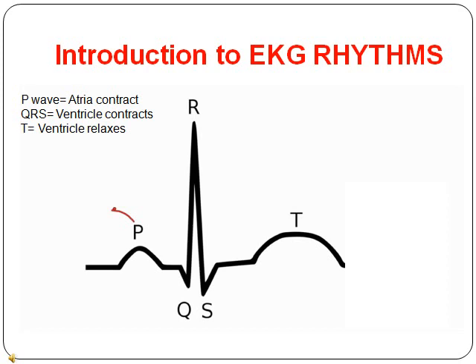So why this is important is because if the P wave is not there, you know it's an atria problem. If the QRS or T wave has something wrong with it, it's a ventricle problem. Sometimes you see a U wave, which is like a little wave after the T. Not every patient has it. They think it's because of the Purkinje relaxing, etc., and you don't have to know that.